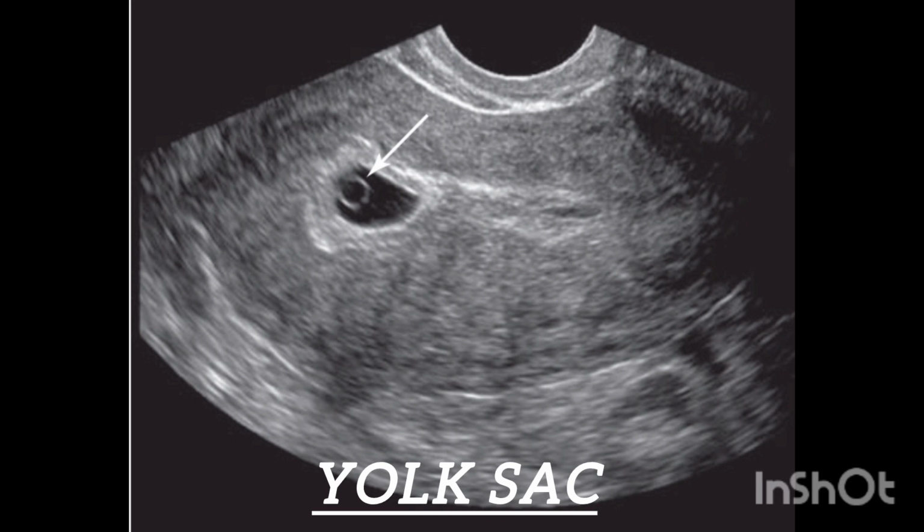It is typically the first sign of an embryo's existence, and it is usually present by 5 to 6 weeks of gestation. A yolk sac that measures greater than 5 mm in diameter may raise concern for possible pregnancy complications, such as the risk of miscarriage.